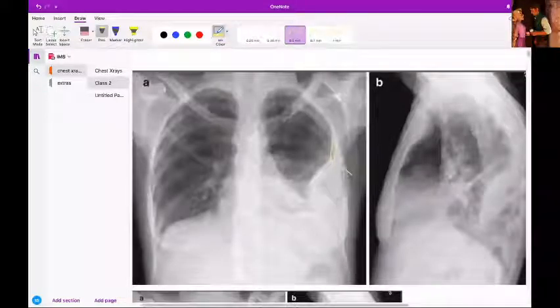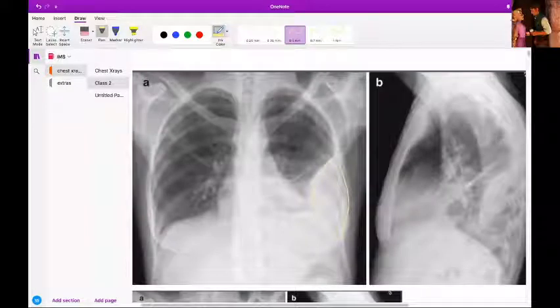There are three things that you'll see in empyema. The first thing you see is this lenticular or biconvex shaped consolidation. Then you'll see this meniscus sign, because pus is thick, it kind of creeps up the sides of the pleural wall. This is pus, not fluid. So it gives this meniscus sign, and there'll be some consolidation of the surrounding lung tissue also. You can see it here. So this is empyema.